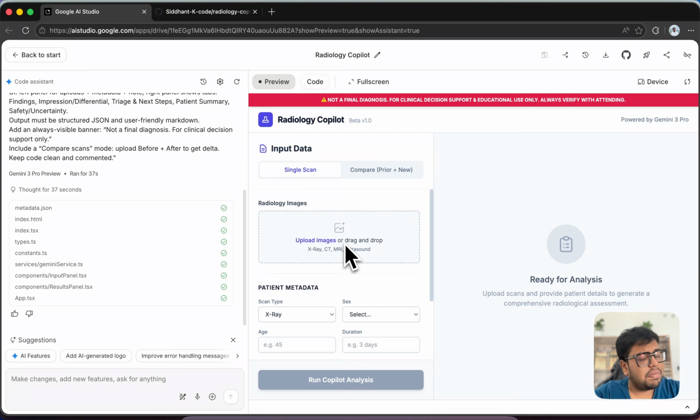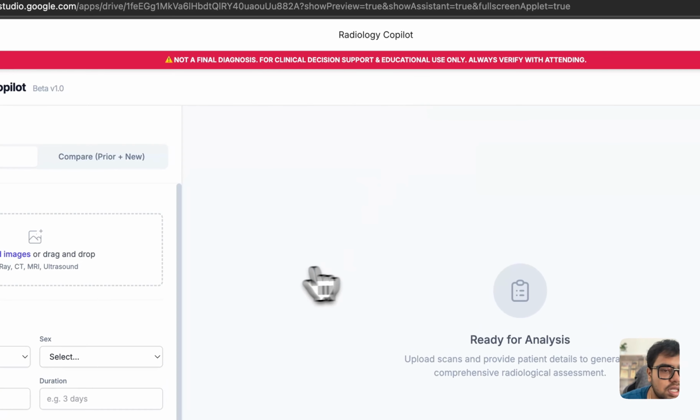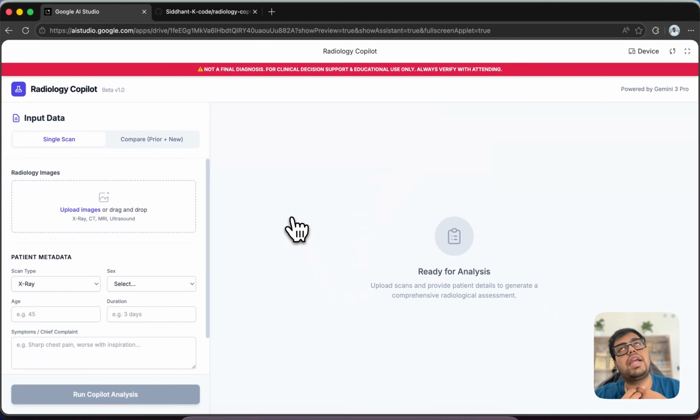But now we have a better way to deal with this. Of course, you still need the image extraction, and that's what I also implemented. I literally web coded it in Google AI Studio, and this whole integration helped me. I don't need to waste time on a Gemini integration, and this is really great because AI Studio can directly do that here. So this is a demo.